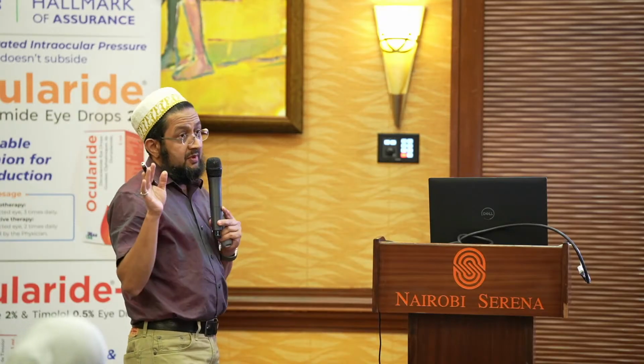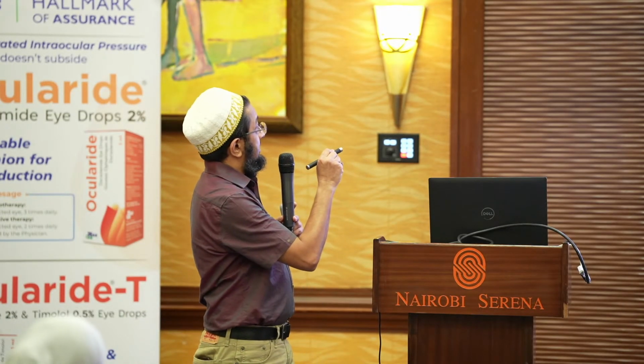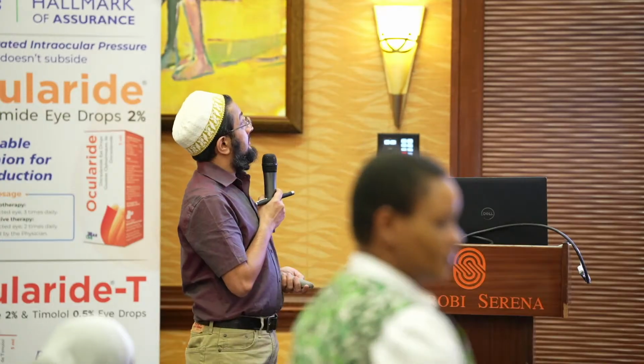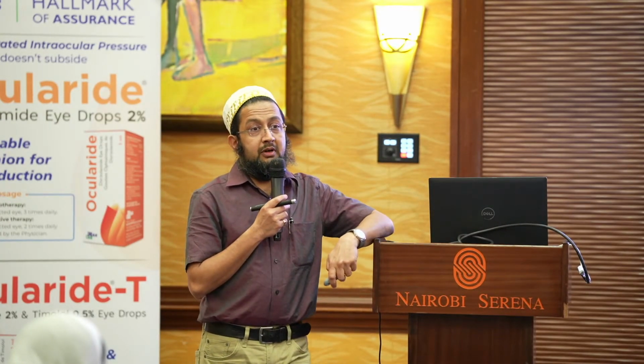These are pictures which have been taken from a textbook. It's not one of my patients, but you can see here there is a bulla, which you can actually tell on the fluorescein angiogram with late staining. And this is how they present in the late stage with sunset glow fundus.